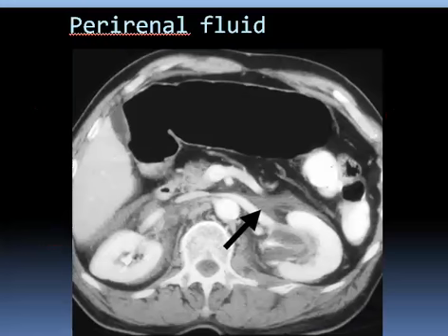This is the appearance of perirenal fluid enclosed within Gerota's fascia, and you know that Gerota's fascia is the fascia enclosing the kidney with its capsule and perinephric fat, reaching down to the iliopsoas fascia. Laterally it is closed, superiorly it is closed, medially in children it is formed by loose connective tissue.